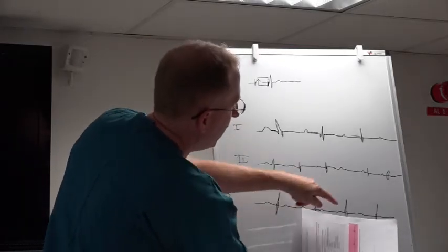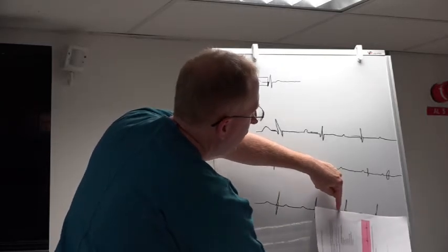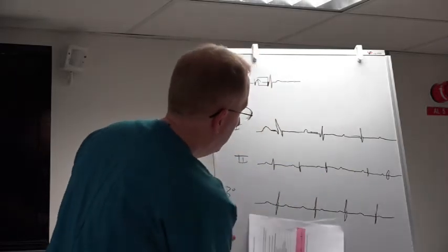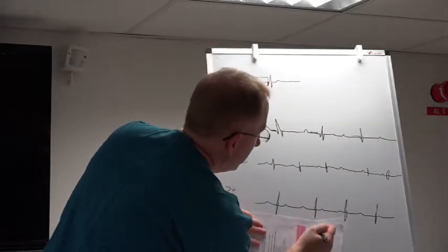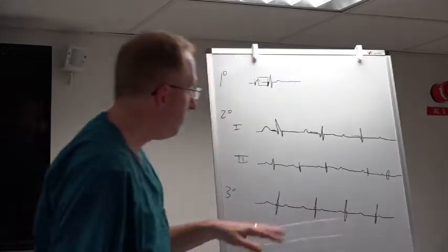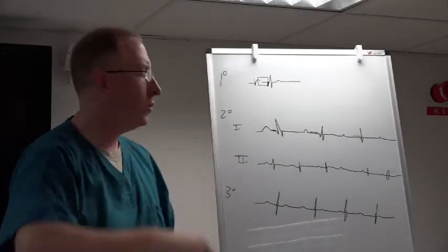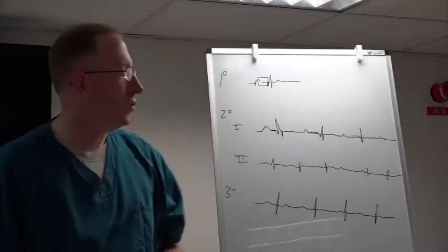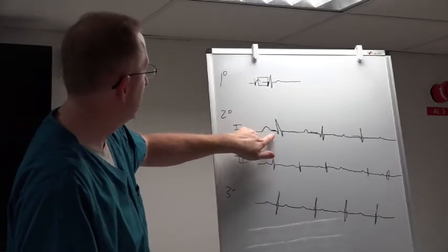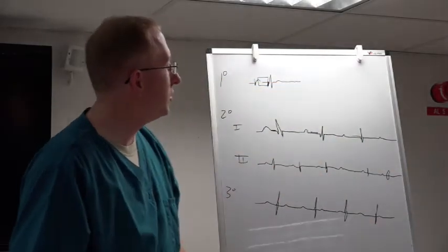And if there's one that disappears inside the QRS, you just see where that would have been, and then you go on, oh, there's that P wave again, and you march out the P waves, and then you take your QRSs, and you march them out, and you're going to see that those are consistent as well. And that's the best way to see the P waves are at their own rate, the QRSs are at their own rate, and there's no appearance of this second degree type 1 where it looks like it's starting to gradually progress before it drops.